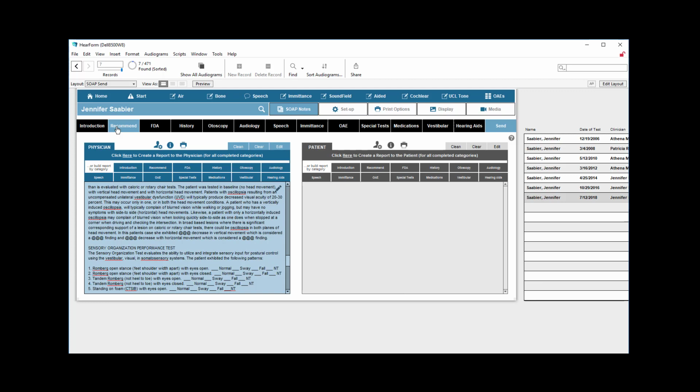After researching this quite a bit when we built the module, a lot of ENTs have told us that they like to have recommendations towards the beginning because they're often very busy, and even though they appreciate a lot of the text that's in a report, they may not have time to read it, but they do want to get to the recommendations, and it helps if it's at the beginning of the report. So you can decide which order you want.